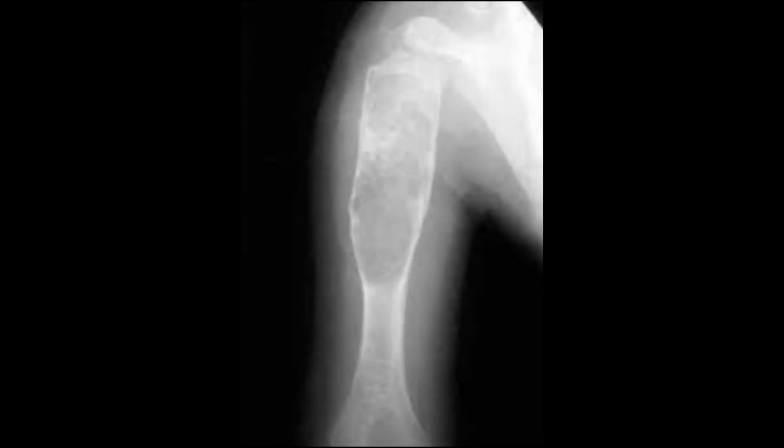This is another example of a simple bone cyst, just to show you that sometimes there will be lobulation, loculation, and sometimes internal septation, which sometimes mimics an aneurysmal bone cyst. But you can appreciate the cortical thinning and the cortical expansion well seen, and from the metaphysis it is migrating towards the diaphysis. The patient is in the second decade of life, and there is no fracture.